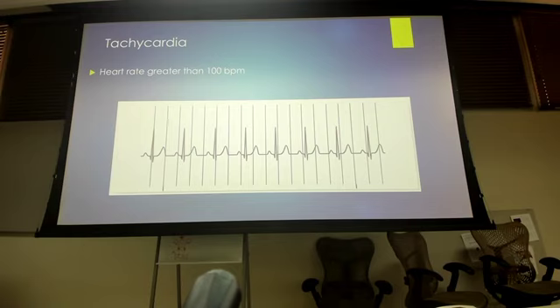Sure, what would it be? 300, 150, 100. Is it closer to 150 than it is to 100? Looks like it. Maybe we're in the 130s or so with this. Okay, so maybe about 130.